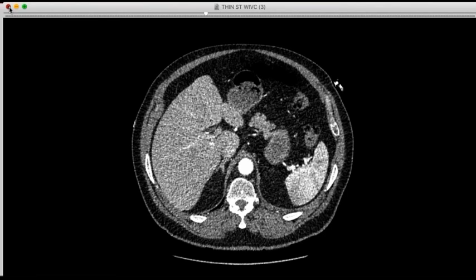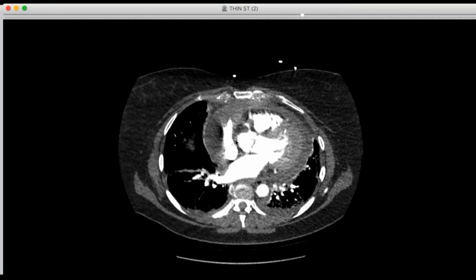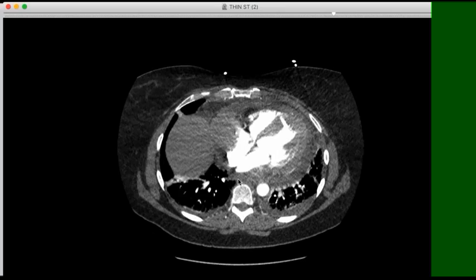Let me show you this one. This is just a pretty one that Daniela showed me from her weekend a couple of weeks ago. This patient presented with chest pain, and this was the CT angio for pulmonary embolism, and there's no PE. But you see this. Oh, I'm sorry. Every time I switch, I forgot I got to switch back. There we go. All right, so here's the CT, and we see there's this nice sizable pericardial effusion here.